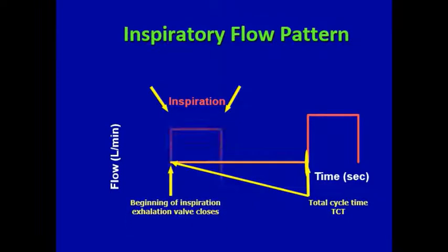So now coming to the inspiratory flow pattern. How will this inspiratory flow pattern be? At the beginning of the inspiration, here you can see, the exhalation valve closes and there is flow of gas to the patient. So up to this point is the inspiration.